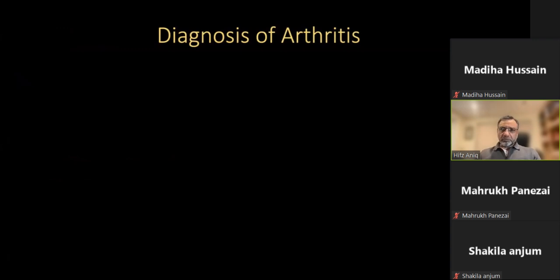Okay. So how would you diagnose this? You have been given an X-ray. How would you differentiate the conditions we just mentioned: osteoarthritis, inflammatory arthritis, gout, CPPD? How would you differentiate? History first, then X-ray findings specific for the specific disease, then lab tests. True. So you said everything right. So we've given you 2 X-rays of the hands. So how would you look at the criteria you use on X-rays now?